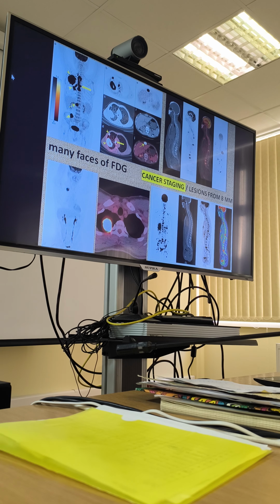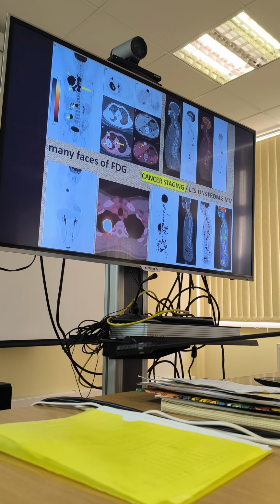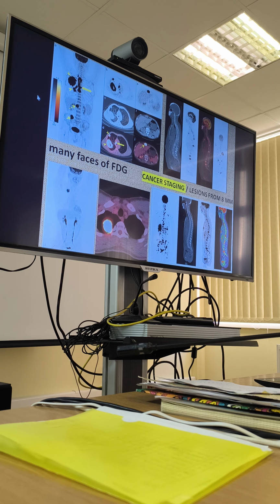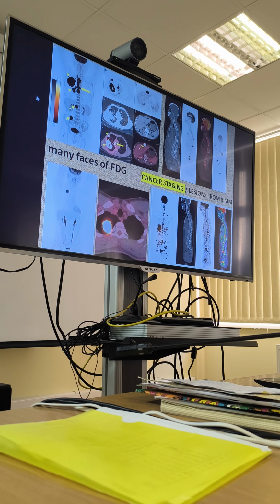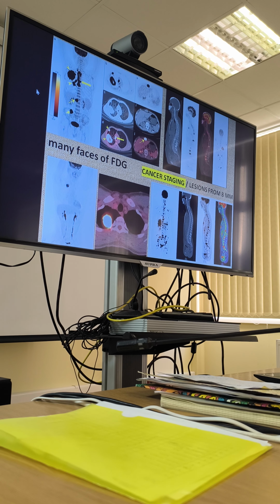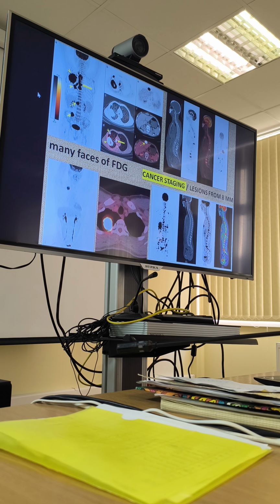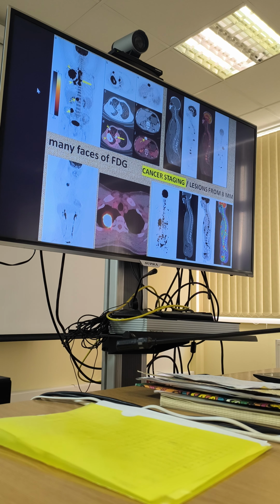And if you look at that picture, again, this summary idea of tumor burden, in this situation what do they see? Not only this tumor, but here and there, in there, and there. And so all these tissues, they are metastasis. And that is that we can say that this is not a localized tumor. This is kind of grade 4, the stage 4 tumor, and that means that we should not start with operation or radiotherapy. They should start with chemo or targeted therapy because the situation is generalized. And this is how it works. That's why it's important to have it in this clinical guidance.